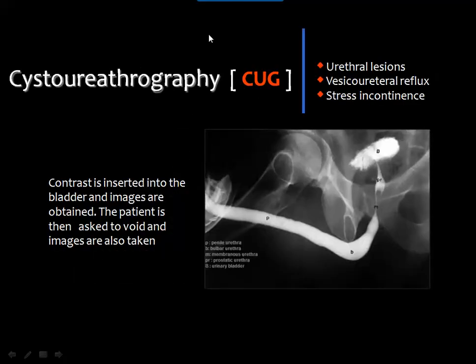This is also another examination which is known as cystourethrography, and this examination is performed by putting the tip of the catheter at the tip of the urethra, and we inject the contrast media. We usually follow the injection under screen control until we opacify the urethral segments, and we have films. Then we may continue injection of contrast to fill the bladder, and after that we may ask the patient to void on the radiography table and to show the micturating urethrogram.